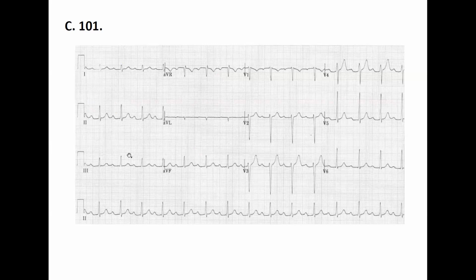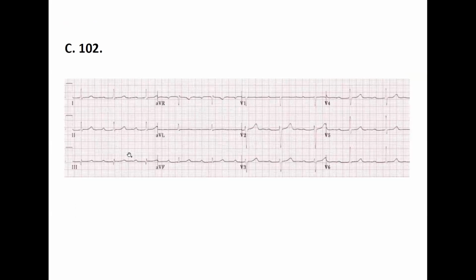Let's go on. 102. Who has 102? Not here. Okay, good. It's rhythmic. The rate is slow. One, two, three, four, five, almost five, so it's close to 60.